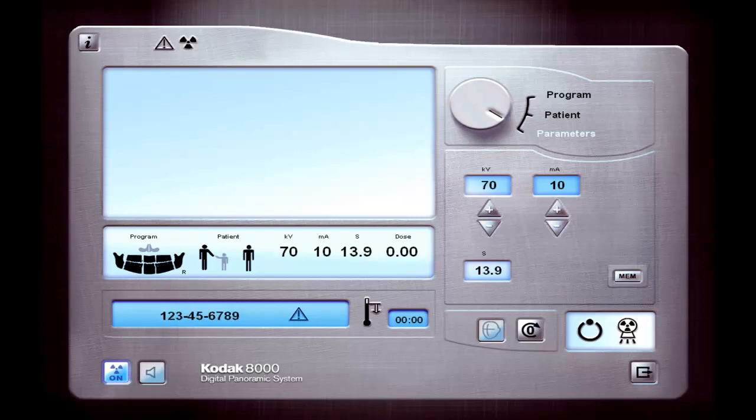Now another thing you'll notice is over here in this one screen, information messages, it is telling you it's the wrong arm position. That simply means that the C arm has to be reset to its home position prior to taking an image. And so what you want to do is look at this little ring right here. That's your ready status indicator. Notice it's black right now.